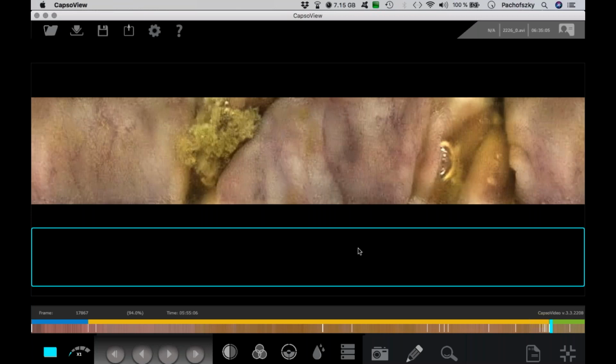So one of the questions from Dr. Ali Madian: please could you clarify the orientation of the arrangement of images on screen? I have difficulty in imagining the horizontal arrangement of images.